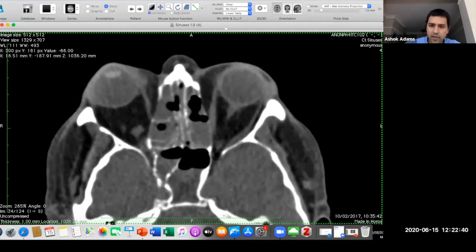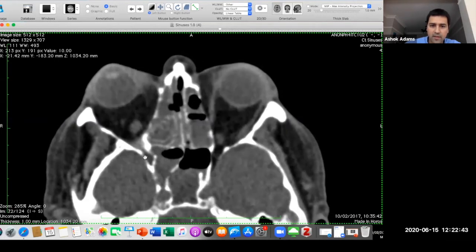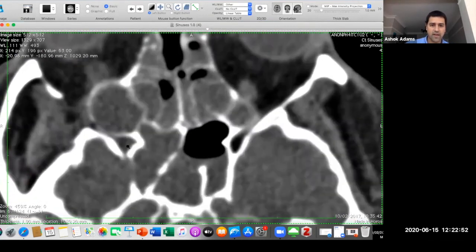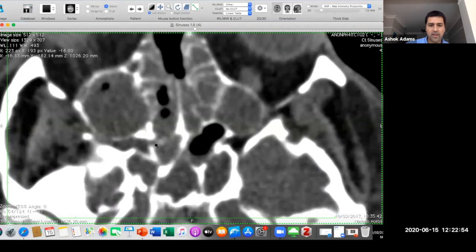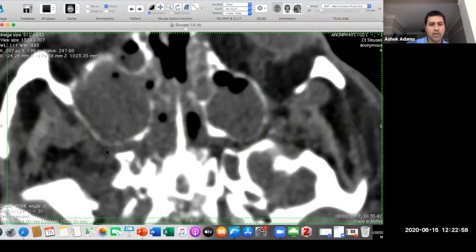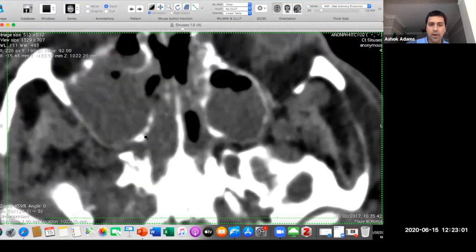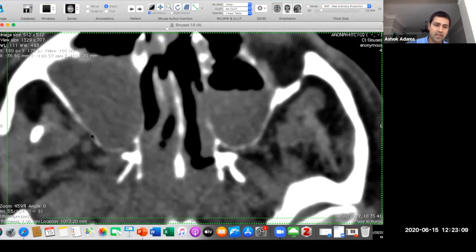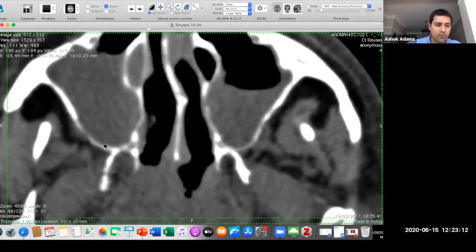It's filled in. That's not the normal dark fat that you're seeing. It's filled in with this material. That's probably the best example. I'm going to magnify it just to emphasize the point. Nice clean fat. This is all dirty fat. And you can see here, as we come onto that pterygopalatine fossa, that's nice clean fat, and that is all irregular. Particularly with invasive fungal infections, remember you don't have to have much in the way of bony destruction. The angioinvasive ones can spread along vascular channels. Here, thankfully, it hasn't really spread into the retroantral location.